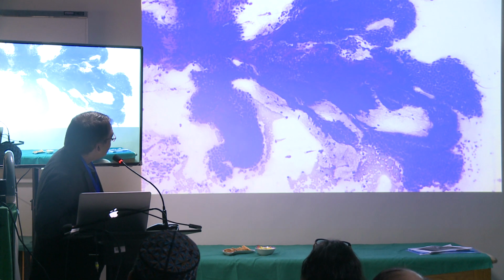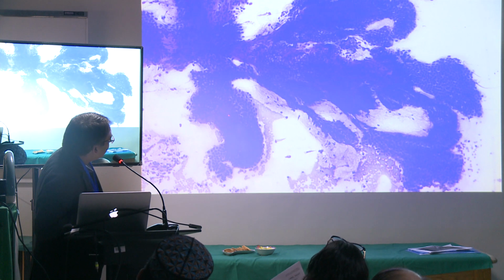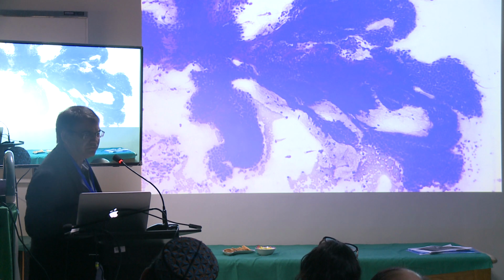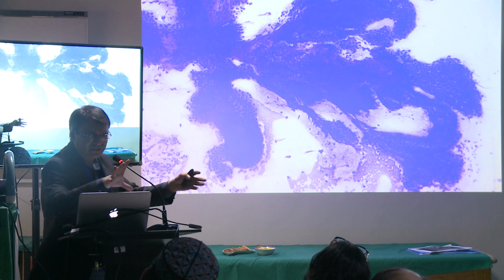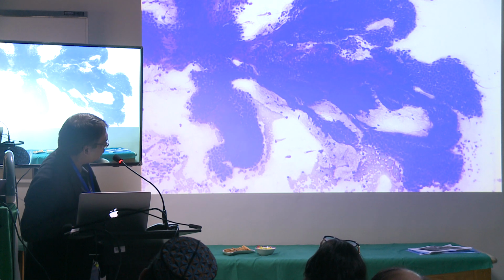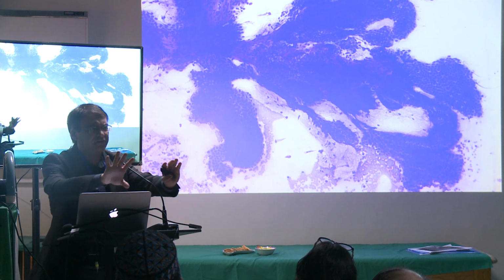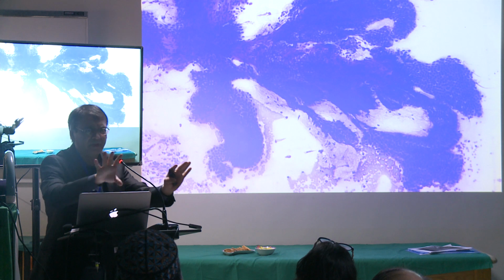Anyway, so here, if you look at those, it pretty much looks a little bit the same, but it looks like the cells may be stretching away from each other, right? You can see there's some fibrous tissue. The fiber always stains a little bit pink, but you don't see really much on that. It's just a little bit stretching, but the size of the cells is still pretty much the same.